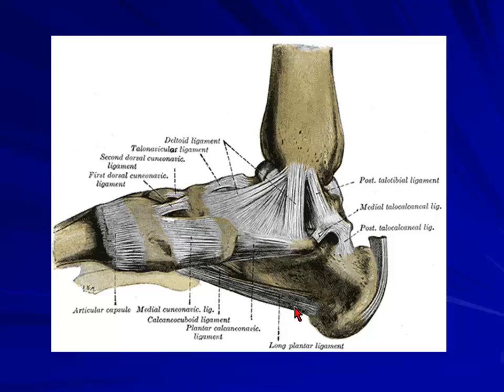This is the plantar fascia. This is the attachment of the Achilles. So what Gopi showed you, you need to know your anatomy well. So if you look at the, I'll talk about Achilles.